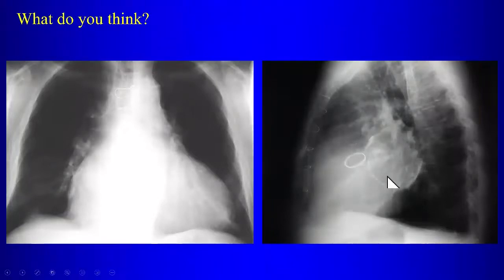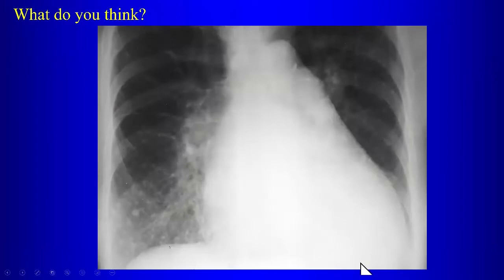Okay, so over here, guys, what is calcified here and what's the significance? Left atrium. Yeah, it's the whole left atrial wall here that is calcified. What's the significance of that? AFib? Yeah, so these patients usually have atrial fibrillation. Again, this is associated with rheumatic heart disease. So they can develop clots there within the left atrium. So calcification of the left atrial wall is associated with rheumatic heart disease, but also associated with atrial fibrillation.